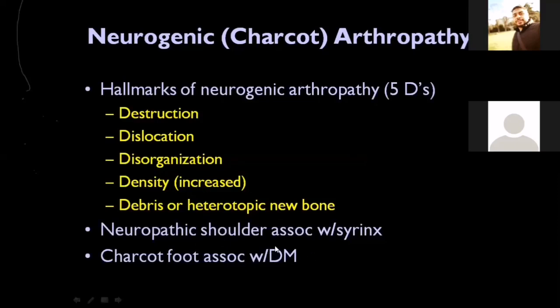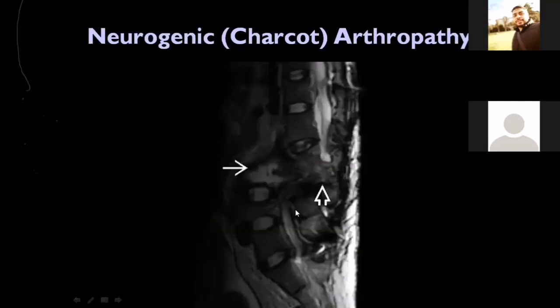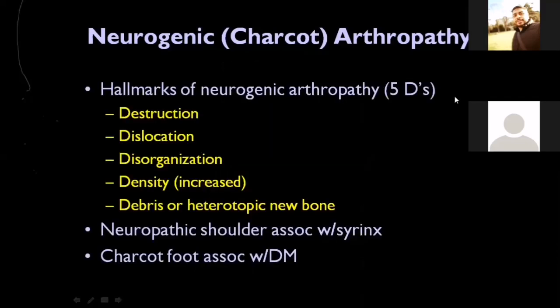Always ask about diabetes. So this is very important in the exam, to not forget it. We will view it in the musculoskeletal when we come to it again. In the MRI, it looks like this, very ugly in the MRI. So think about diabetes and check it quickly, carefully, sorry.